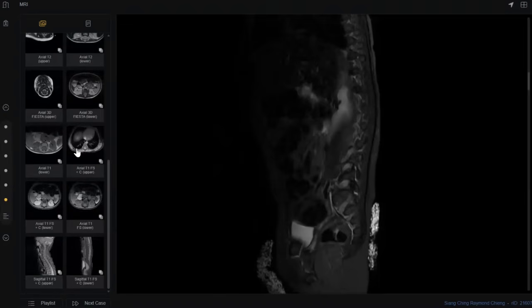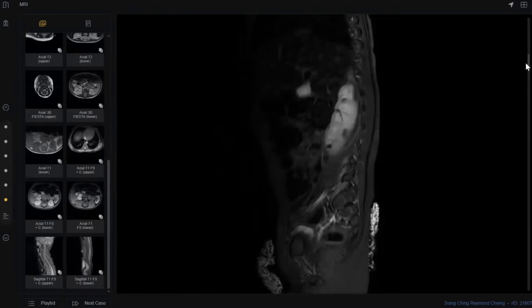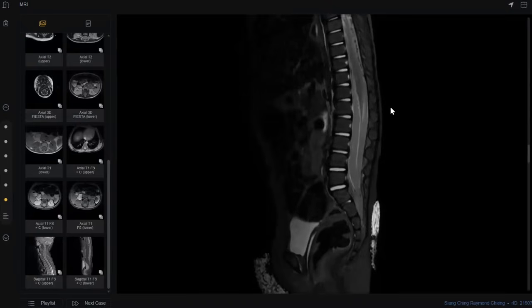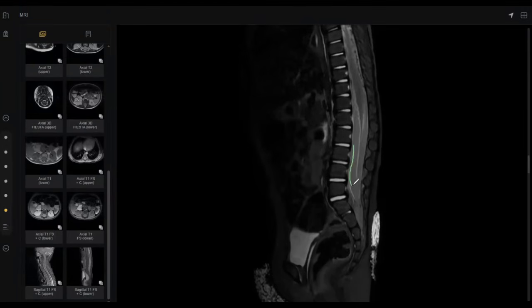Leave the mouse once again. You told this is a STIR, correct? Sir, in a STIR, should you see the CSF of intermediate signal like this? No, it should be high signal. So all of this are leptomeningeal metastasis or meningeal metastasis, and all of this also.